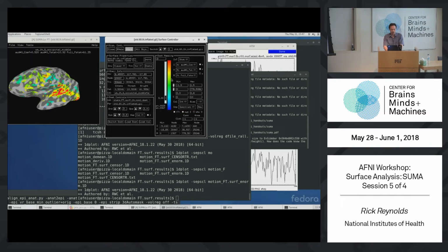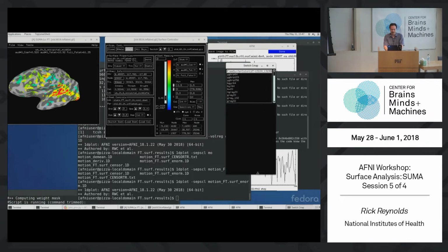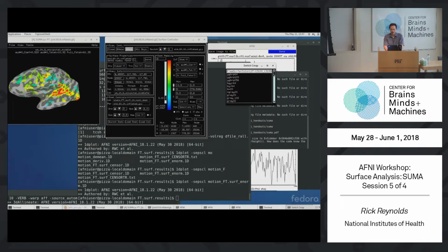You can choose a color scale here too, but that's the CMP line. I'll just mention that briefly. CMP, this is the color map choosing. But don't click on that because you'll lose your color map and then you'll have to find it again. This is an example where you might actually want to right-click on the CMP text to open up a window like this. It doesn't help to stretch it, but you can at least page through these things, and it's an easier way to see all the color maps. Anyway, are we all looking at basically the same image? Any trouble with that?